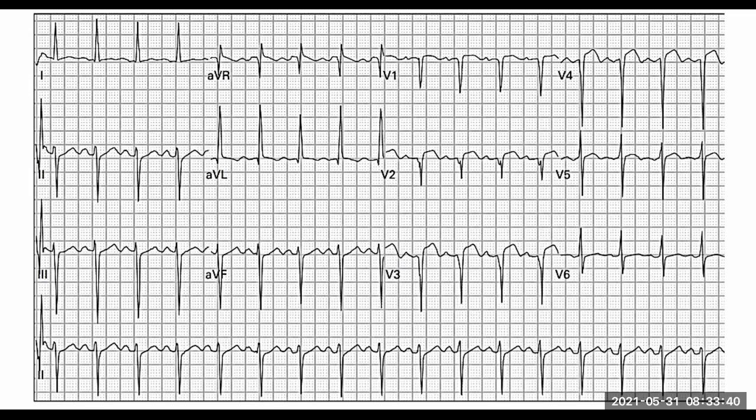Well, there's two things actually to notice. What do you notice here? What's this wave called? P wave, isn't it? What's happening to our P waves? Do they look normal? No, it's almost like a biphasic something. So something is happening in that area with the atrium from that point of view.